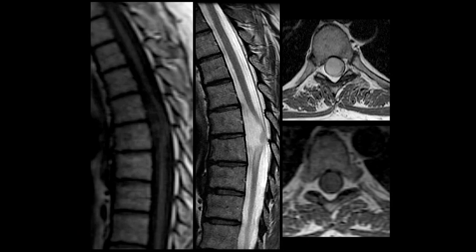As against that, notice that we have a cystic appearing lesion seen not along the dorsal aspect of the cord, but along the ventral aspect of the cord. It's predominantly bright on T2. It appears slightly brighter than the CSF on T1 weighted images, and on contrast axial images, no enhancement is seen. Well, one can consider the possibility of an arachnoid cyst, but then why is it slightly brighter than the CSF? It should be isointense to CSF. It's slightly brighter than the CSF.